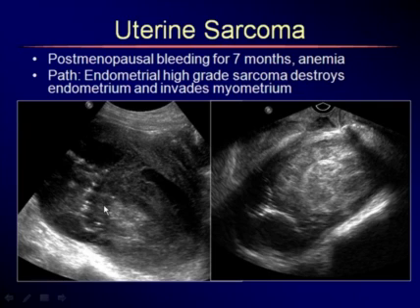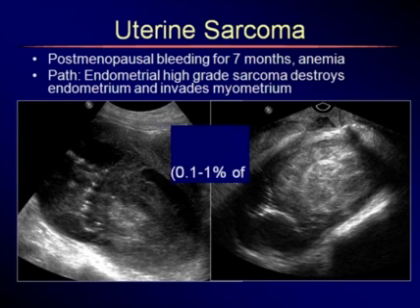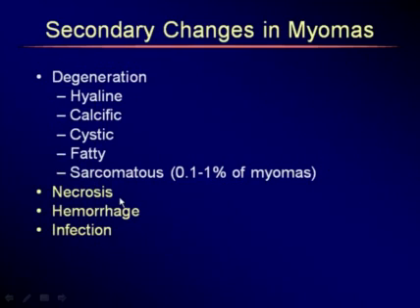So this was very difficult. At first we thought this was going to be a leiomyosarcoma because the bulk of it looked like it was in the wall. So that's kind of, in the back of your mind, an unusual tumor to differentiate, or at least not be surprised at the final impression of the pathologist.